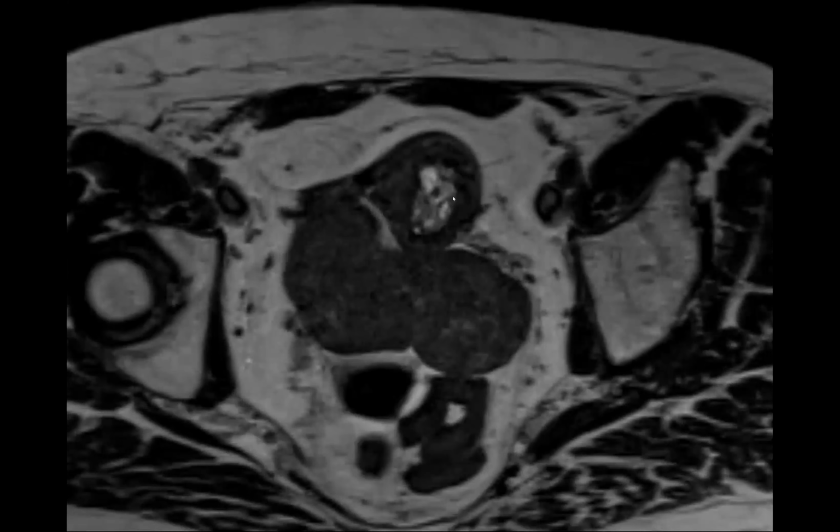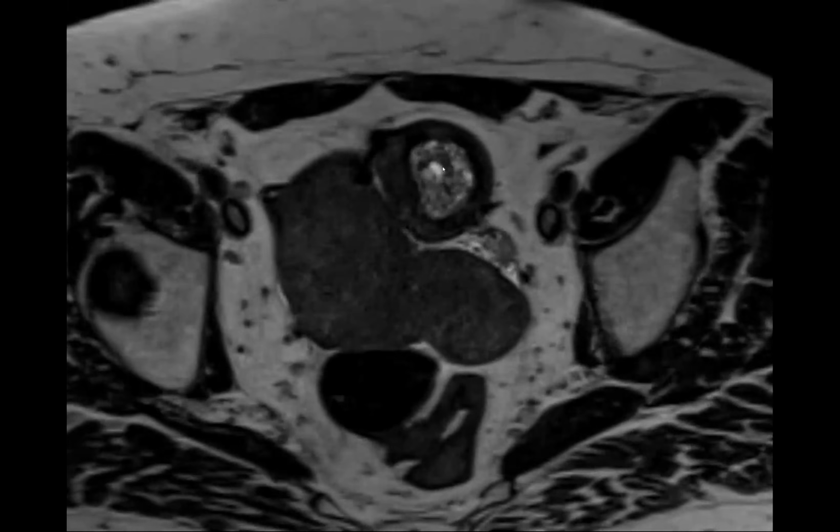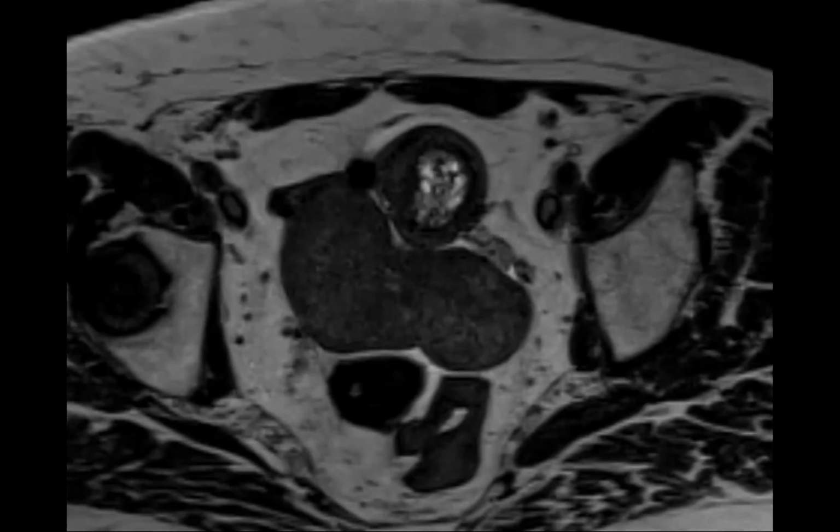Oh, the other cool thing, this stuff I thought was going to be endometrial hyperplasia, and this was all an endocervical polyp. Oh, wow. I'm going to show you. And yeah, polyps can be cystic like this.